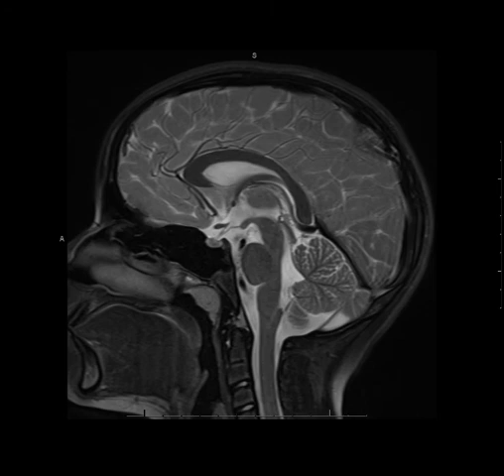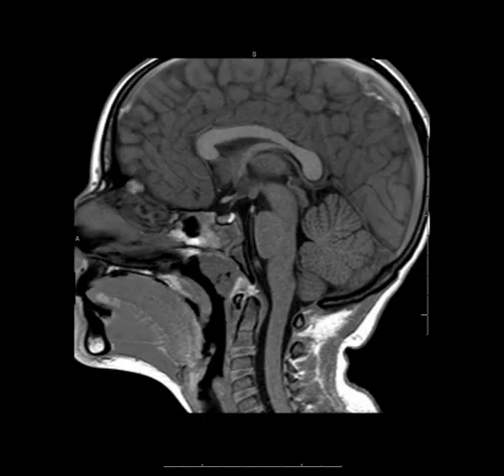Okay, we're switching gears for a second to the midline sagittal T1 weighted image, where gray matter is gray and white matter is white. We call that anatomic gray-white differentiation, which is the opposite of a T2 weighted image. Again, you'll notice that the CSF signal intensity is quite dark, and I would draw your attention to the posterior pituitary gland, or the neurohypophysis, which is quite bright on a T1 weighted image.